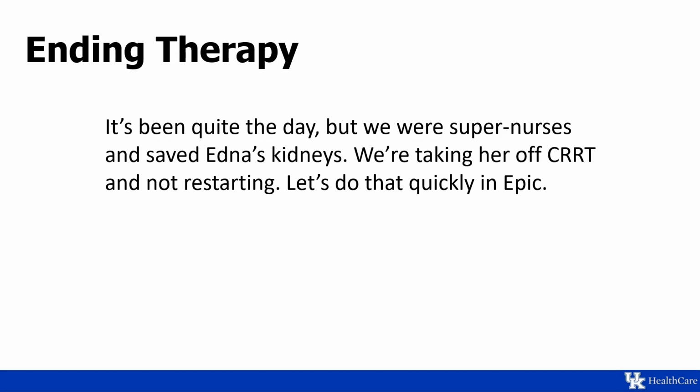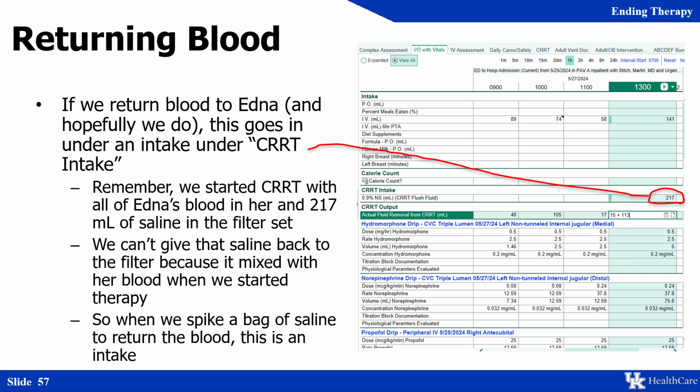We have saved Edna's kidneys somehow. And we're going to chart how we stop CRRT when we're not restarting. First, we're going to show that we return blood, because if possible, we'd like to return the blood when we change a filter. That's a volume of 217.